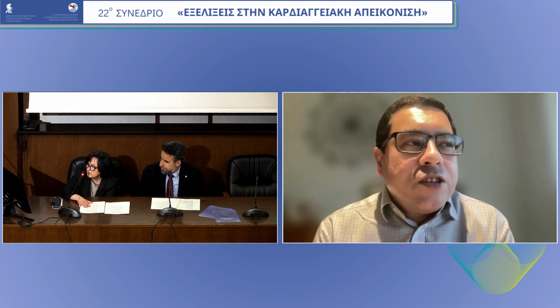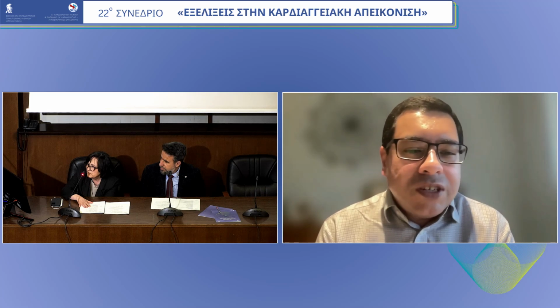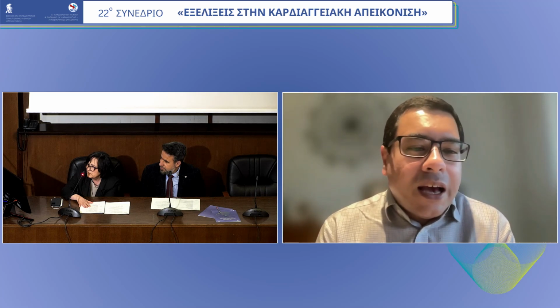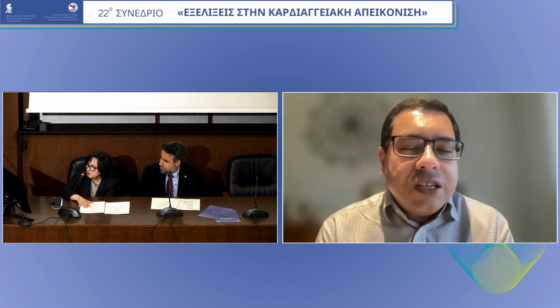The difficulty is when you have someone with a history where you suspect thrombosis because the INR is low, etc., and you can't see a thrombus. And sometimes, even despite spending a long time doing TOEs, trying to get every angle, if we're not able to see thrombus, then we've seen it on the CT.